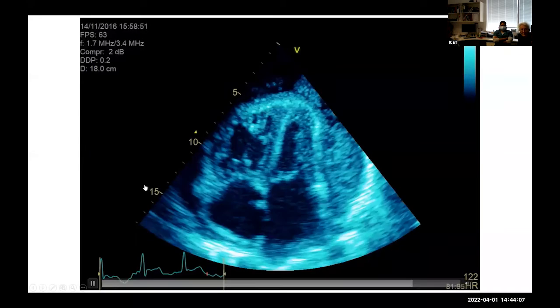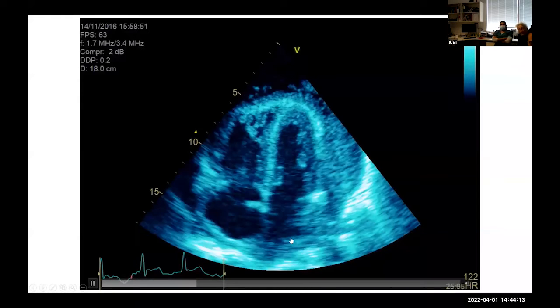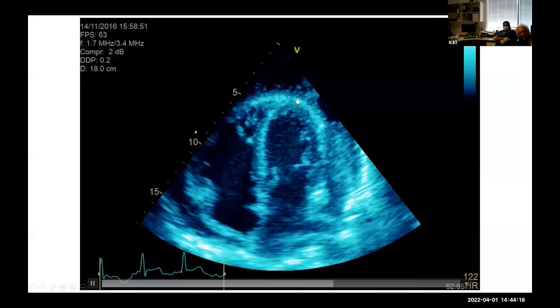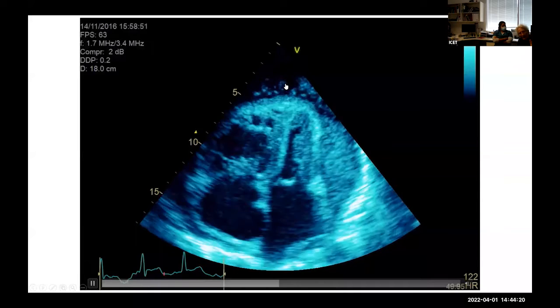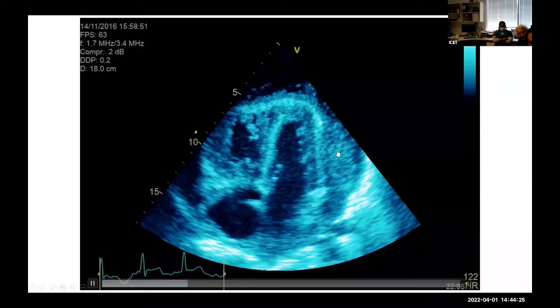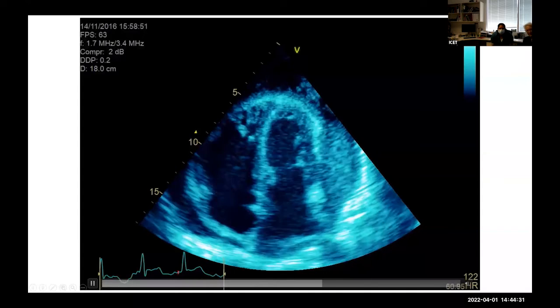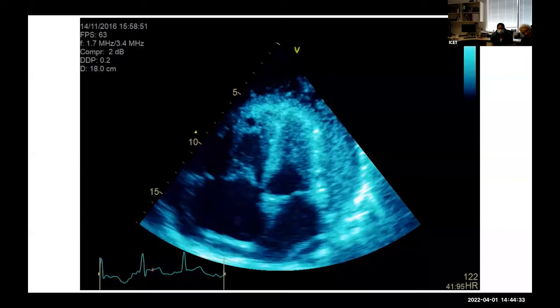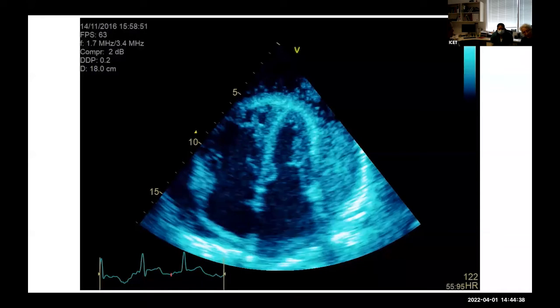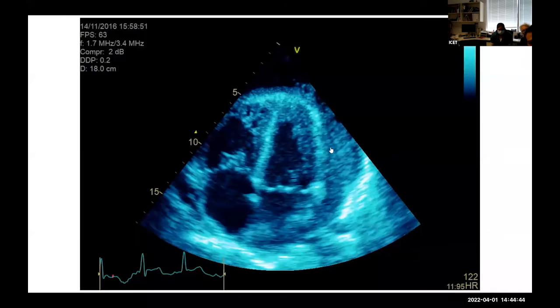So we've now transitioned to an apical 4 chamber that is relatively well on axis because I can see the pulmonary vein. So there are, once more, multiple abnormalities in this film. The most striking abnormality is the presence of a large circumferential pericardial effusion that appears to be quite exudative in nature with echo-dense material floating in it. I'm assuming they don't have a pericardial line and you haven't given bubbles, because that would be a differential here. No, that's all his own work.